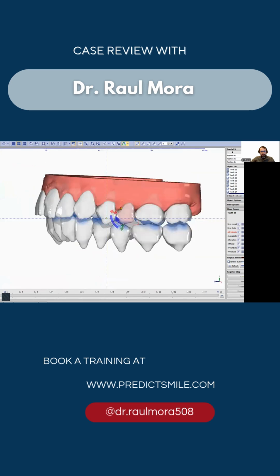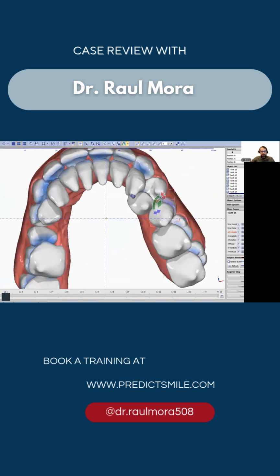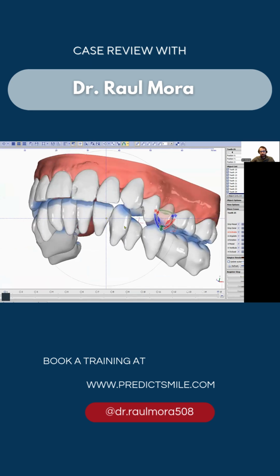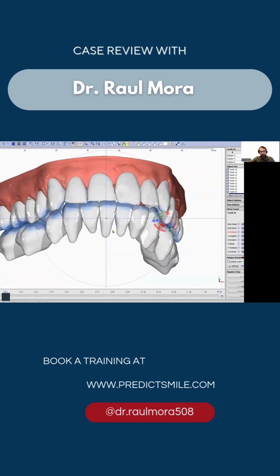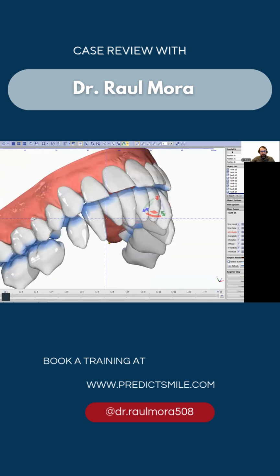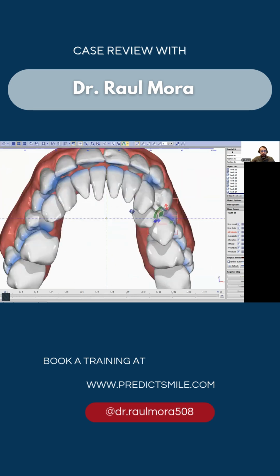If I have contacts, the bite jump is not going to happen, because we need to close the open bite. They created a treatment plan trying to solve this cross bite here, but they just created the open bite and the cross bite wasn't fixed. So now the doctor only wants the anterior treatment plan and closing the posterior segment. And this is done by disoccluding and creating a jump. The mandible should close after we have released or fixed the premature contacts.